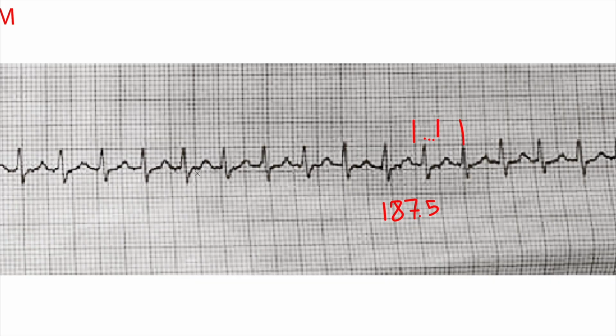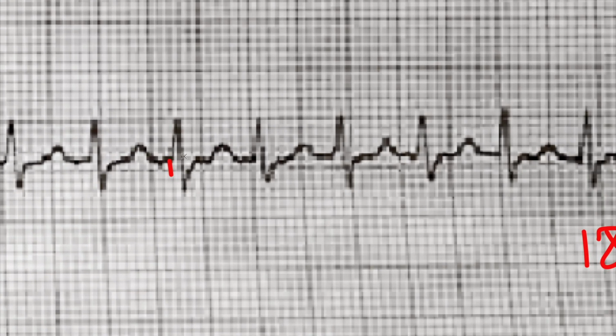When we take a look at the QRS, it appears to be narrow, right? And by the way, just to take a moment, the quality of this ECG is not the greatest, at least the format we received it in. So I'm guesstimating here that the QRS is roughly 2, maybe 2.5 small boxes wide. It's still narrow, right? It's still less than 120, and in this case, I think it's less than 110 milliseconds long. So this is a narrow QRS.